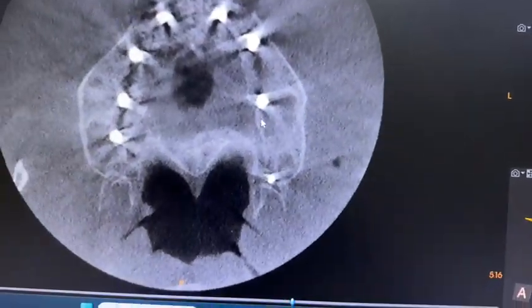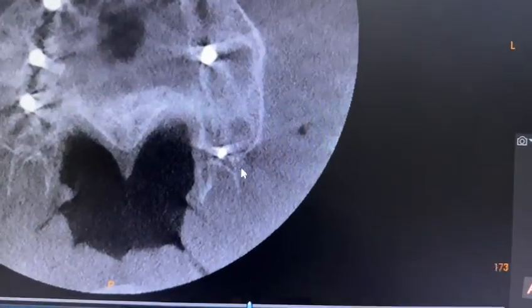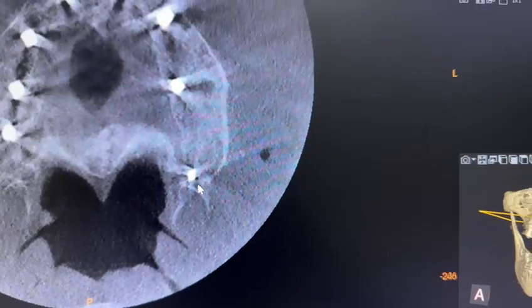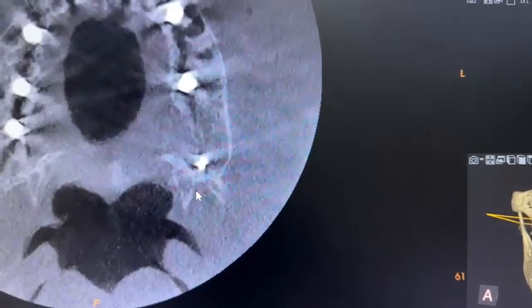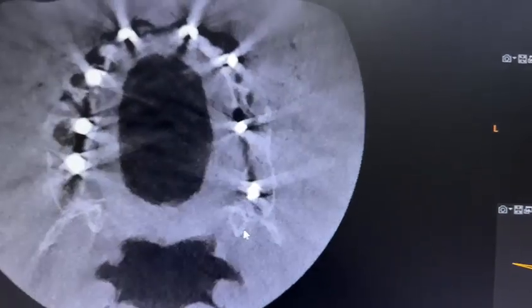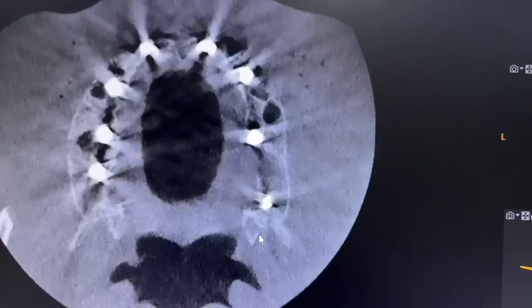So this is the axial section view, which is good for analyzing the pterygoid area. So this junction is the pterygoid. So this implant has gone till the pterygoid but not exited the pterygoid. So it is starting from the second premolar and going near it. So on the right side we have avoided the pterygoid, on the left side we have placed the pterygoid implant.